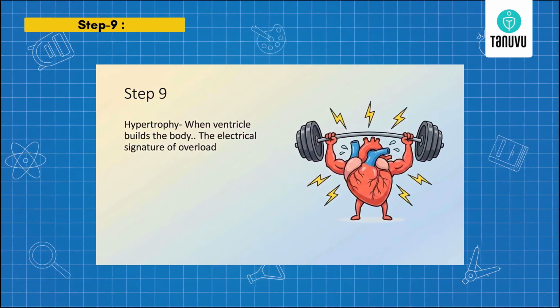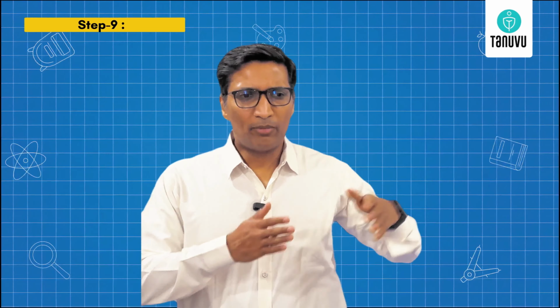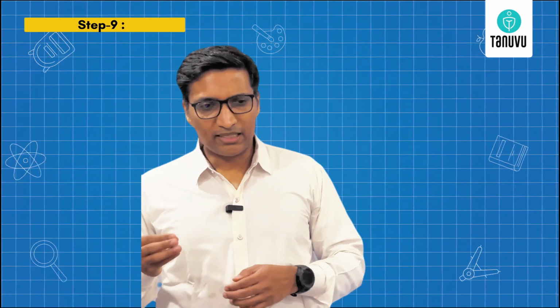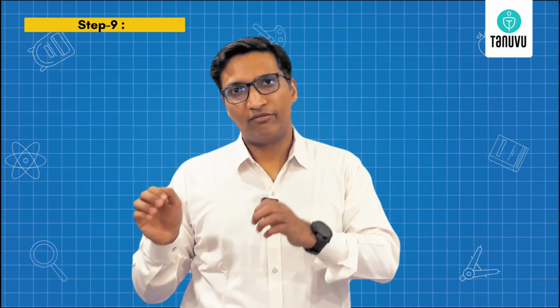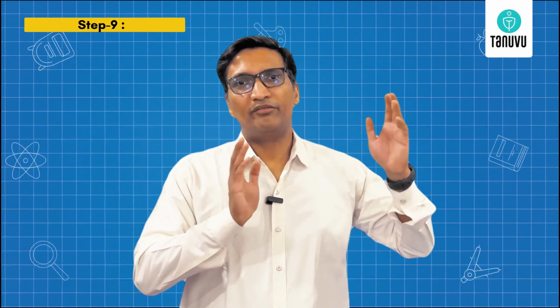Step 9 is to understand ventricular hypertrophy. You have come a long way in reading ECG, starting from the basics to the AV blocks, to the tachyarrhythmias and myocardial infarction. So the next step is to understand when the heart is a bodybuilder and is electrically and mechanically overloaded. So let's understand the changes that are seen in this. How the hypertrophy happens, and why the ECG shows these changes, is not a discussion for today. That is a point of discussion somewhere else.